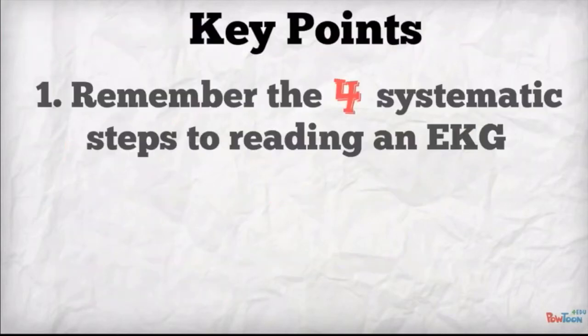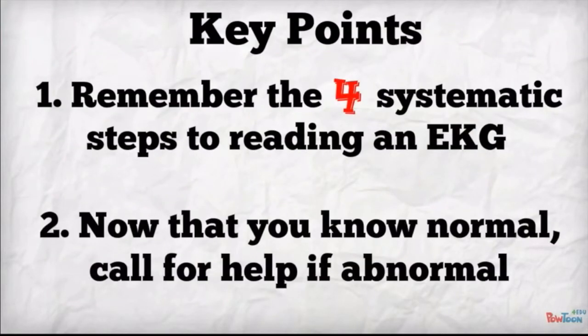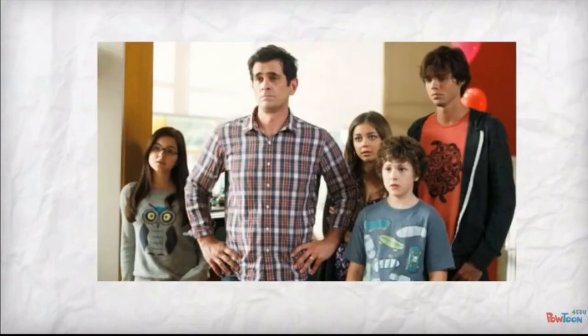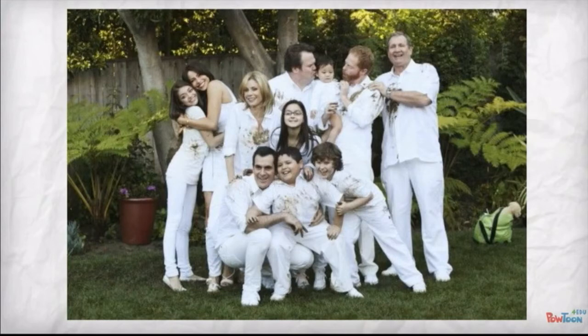So the key points, remember the 4 systematic steps to reading an EKG, and now that you know normal, call for help if abnormal. Now the family that was worried and concerned can feel happy and relieved that we are now confident in reading an EKG.